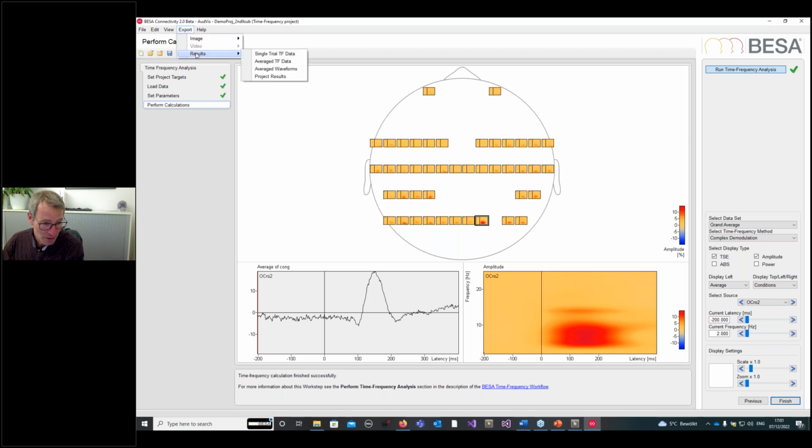So here we would go to the results and then project results, and this will then trigger the actual final export of everything. So pretty straightforward, I think.